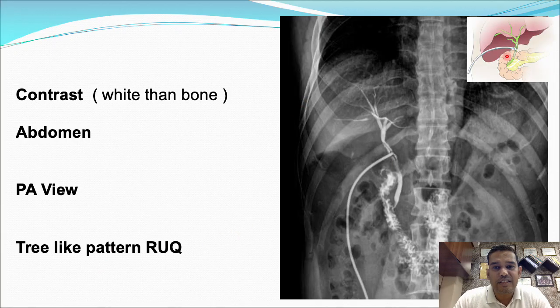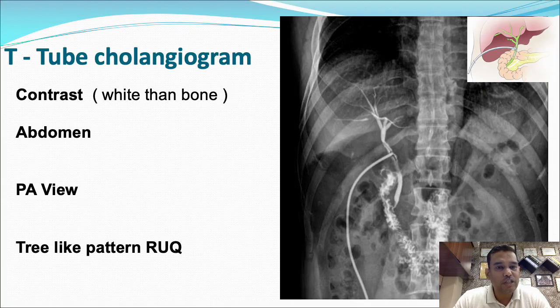You can correlate with this diagram. This is the normal diagram of the T-tube. It's a T-tube cholangiogram.